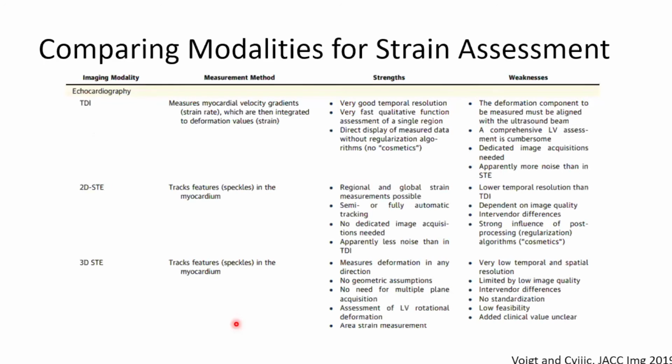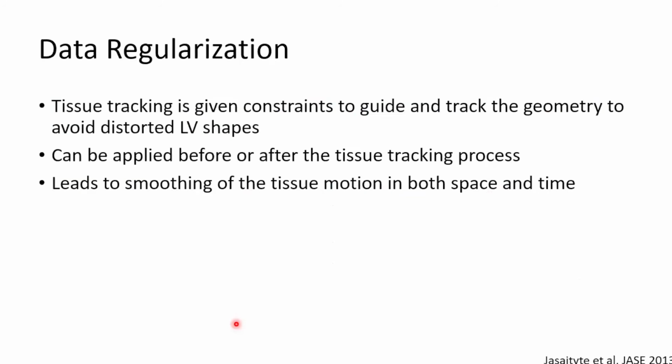So it's possible that where there's abnormal motion, the computer has sort of softened or normalized it in some ways. Where there's pathologic motion, the computer could actually fill in some holes and make it look more like normal motion rather than truly pathology.